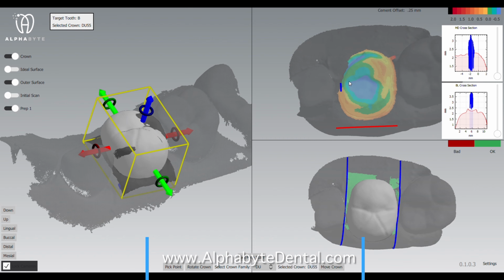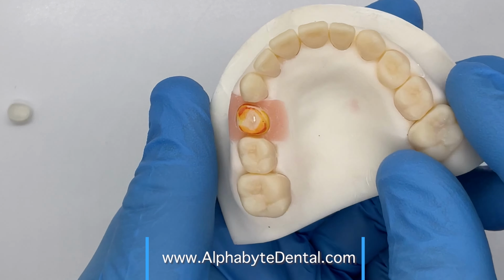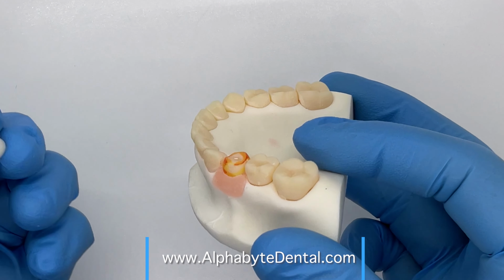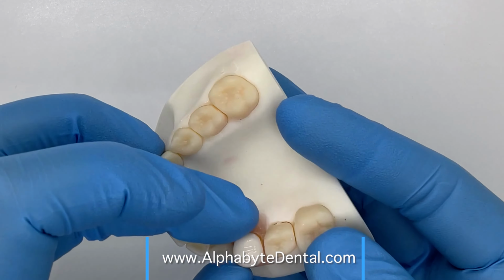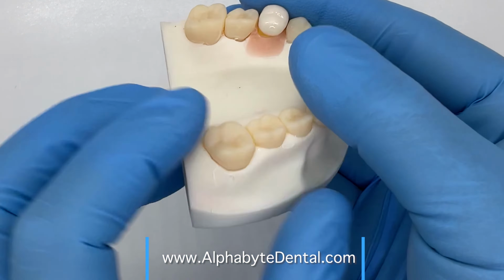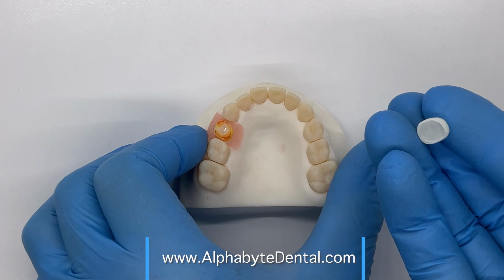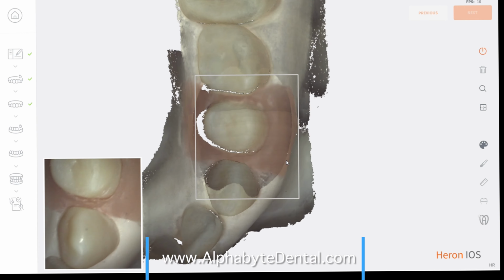It's as if your professors from dental school were to mark up your initial preparation attempt with yellow, orange, and red highlighters and show you exactly where you have messed up, exactly where this tooth requires further reduction to receive that ideally selected crown size. So no longer do we have to blindly go back and refine these preparations, further risking secondary pulpotomies and over-reducing certain areas. No longer are we confused as to have we selected the right crown in the first place. So we can go back in and refine our preparations and retry the crown, and if it fits, we're done.